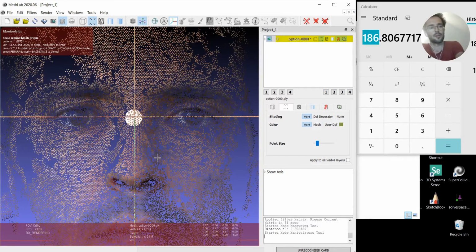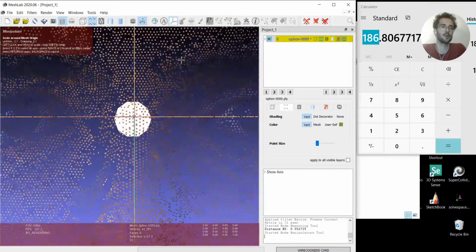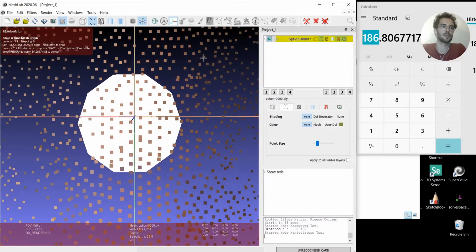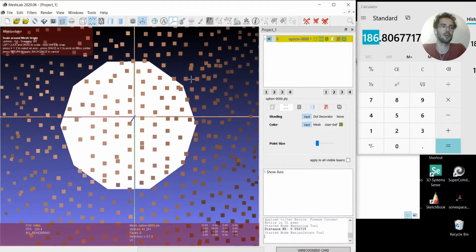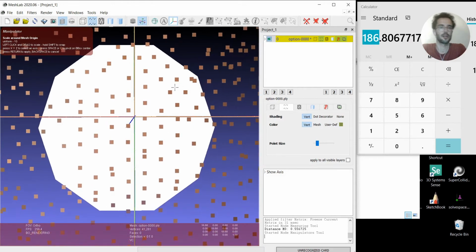Didn't catch the enter. Okay, so we are now back into the tool. Again, scale. The scaling factor is reset, so we can go to 10. In the options you can see hold shift to snap, so we hold shift and drag, so we can move about just more precise numbers. So we just go till 10, precisely 10, and then enter again.